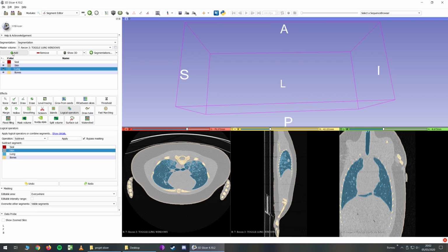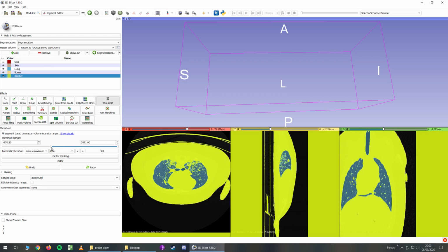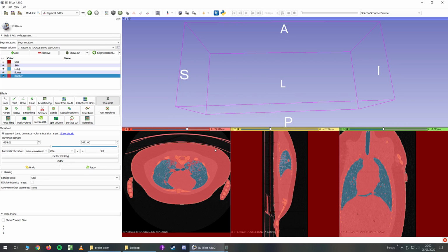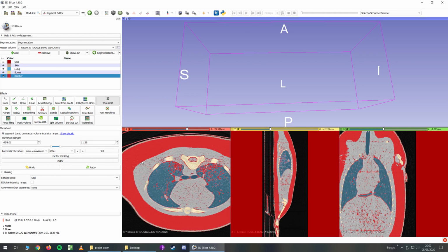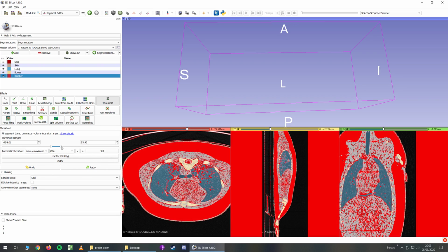And now what we are going to do is the blubber, which is this fat here. So let's use the same tool, threshold, and we are going to work in the table inside seal and overwrite none, of course. So now we choose the right density. It's painful for the eyes, sorry about this. Okay, so let's set it to the right density, and this one should be fine. You cannot have a perfect density because you cannot have all the segment filled and all the segment empty. So you have to make a compromise, and you can fix this again later.